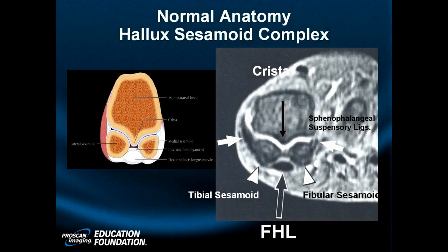So two sets on each side. And you are seeing the tibial suspensory ligament medially, and this happens to be the metatarsal suspensory ligament. It's not so important you differentiate which suspensory it is, as long as you identify that they are there. They function in a way that's somewhat analogous to the accessory collateral ligament.